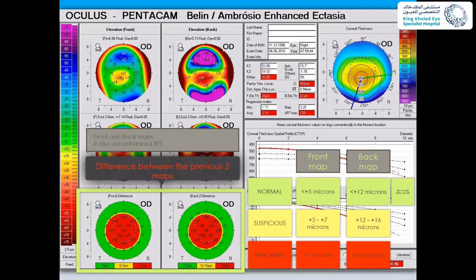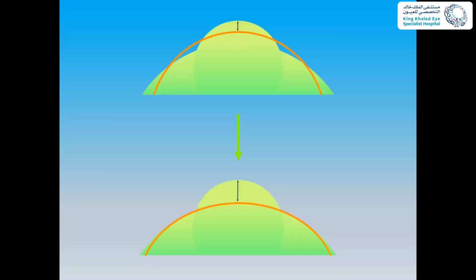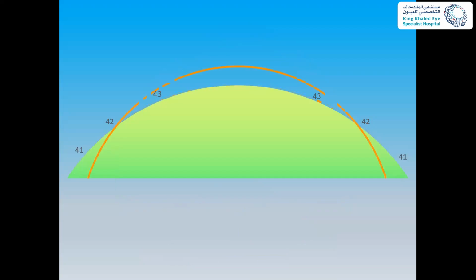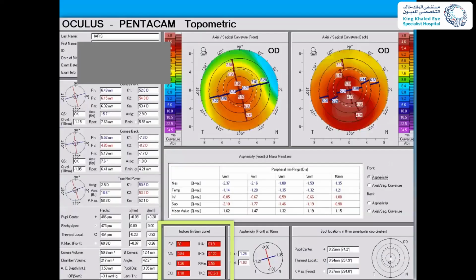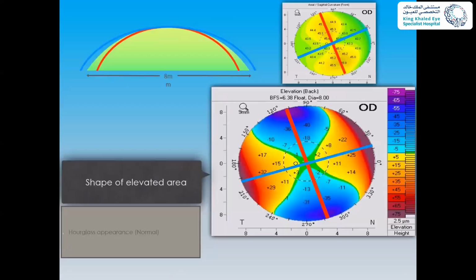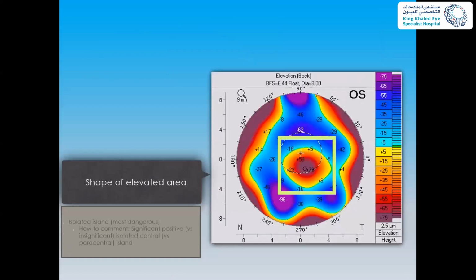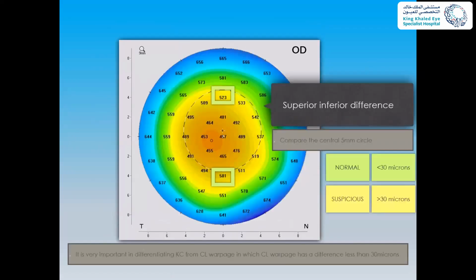see the E case, and if I have got a good peak, I tell them that I am quite comfortable that what I am planning will hit that target. But if I don't see any peak, then I tell the patient, there's a chance your cornea is too irregular. My feeling is we may not be able to hit the target, and you may end up with more myopia or more hypermetropia. This is where I don't use it.